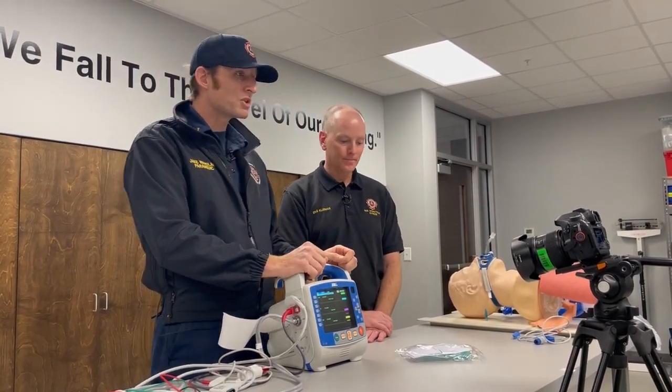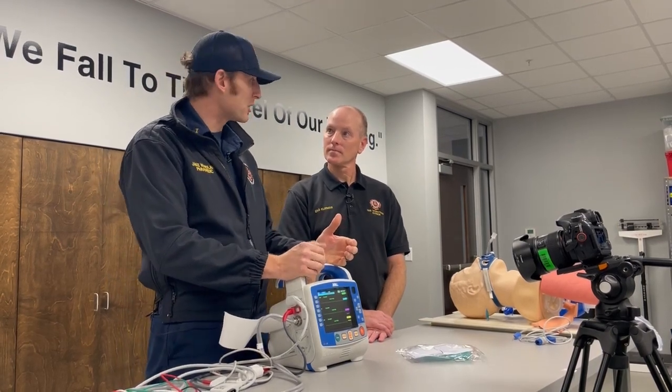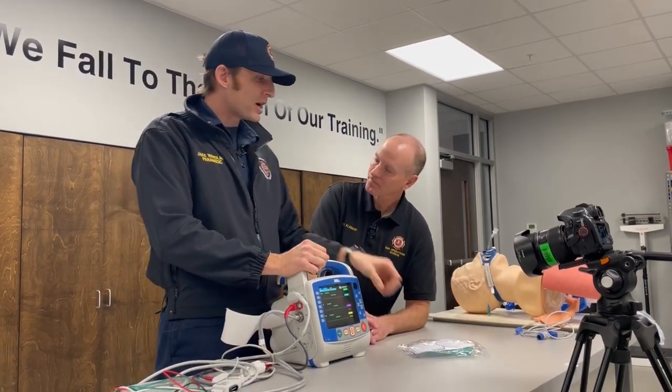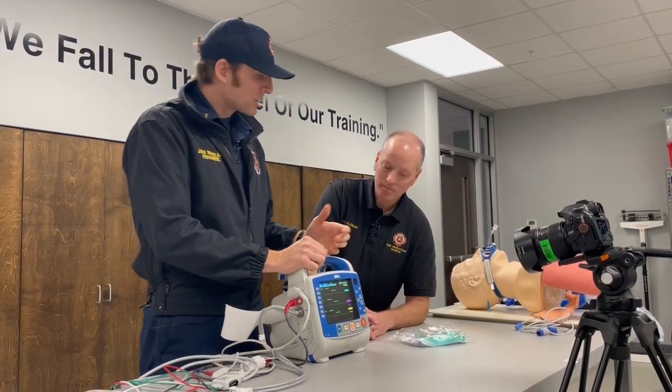Yep. So we talked about what we're looking at. We're talking about who we apply it to. Now let's talk about the devices themselves and how we actually hook it up to the monitor. So we have multiple devices. For the purpose of the video, we're going to talk about one of them. The one we're talking about is actually a nasal inline filter. It looks like a nasal cannula. It's green. So let's go ahead and open it, David.